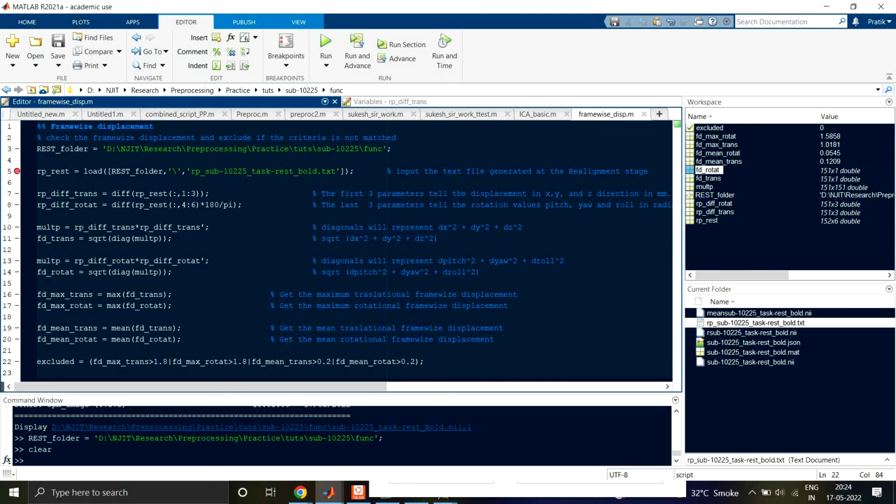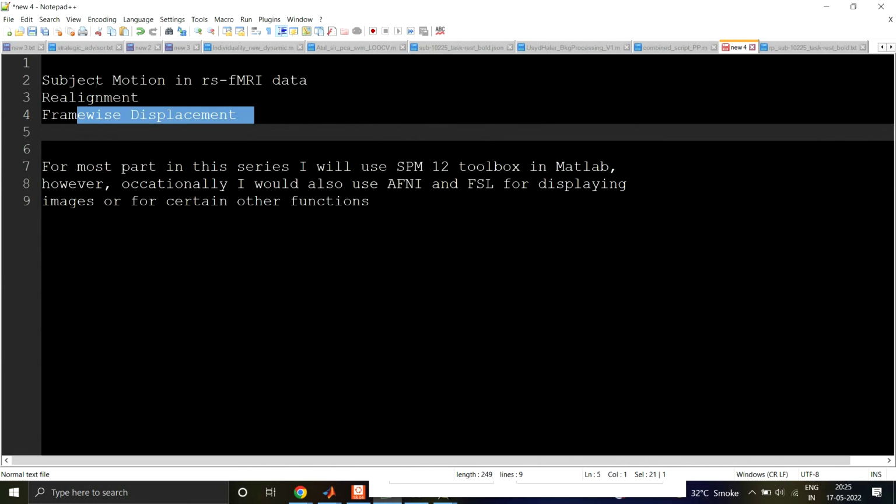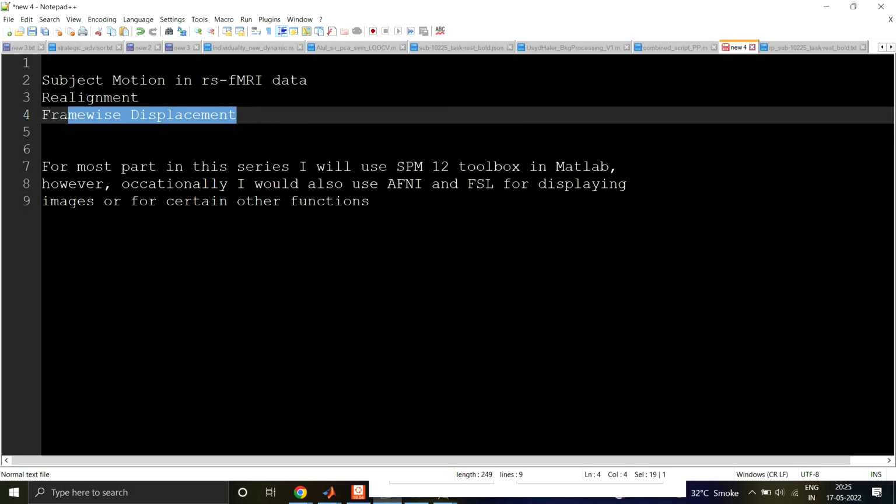In this video I have covered, first of all, what is subject motion, which we saw in the start, then how to remove it, and then frame-wise displacement, which will help you exclude or include a particular subject for your analysis.